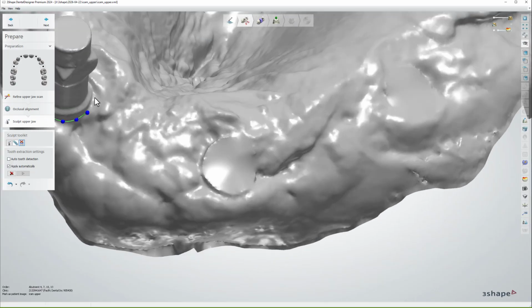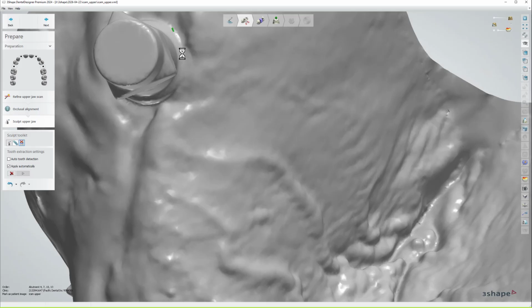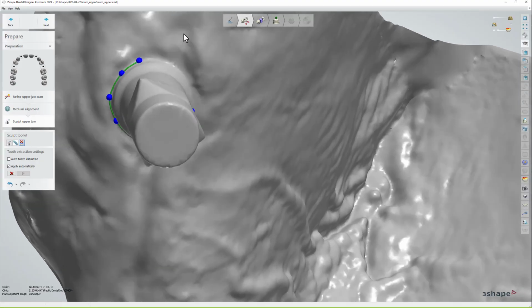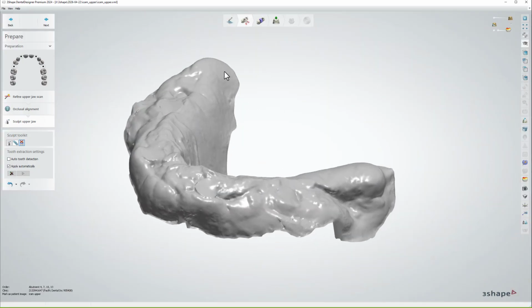And this is what you didn't see me do in the design because I'd already had it all done. But we're going to do this once, and it should, oh, come on. You move your mouse a little bit while you're doing the click, and it decides to do the whole thing for you. So cool. We got this set and done.